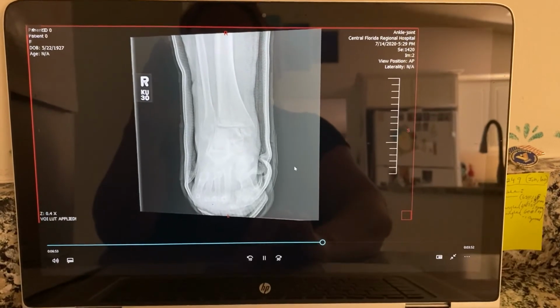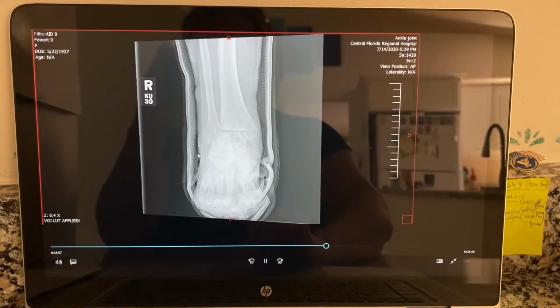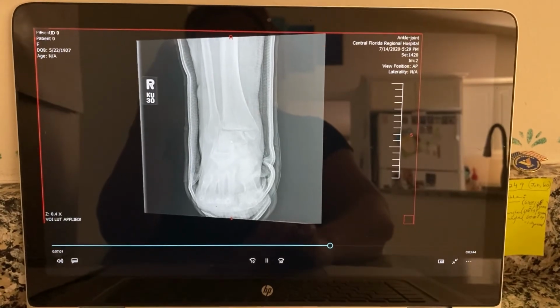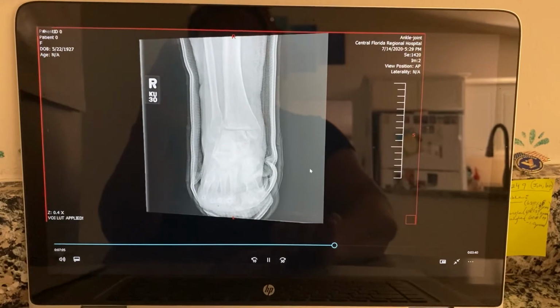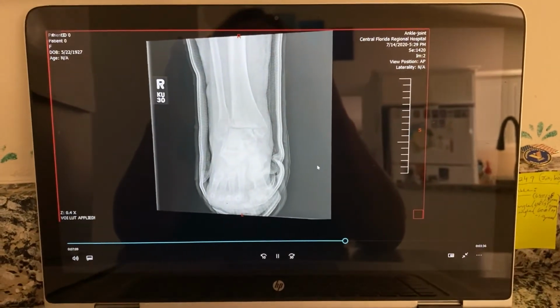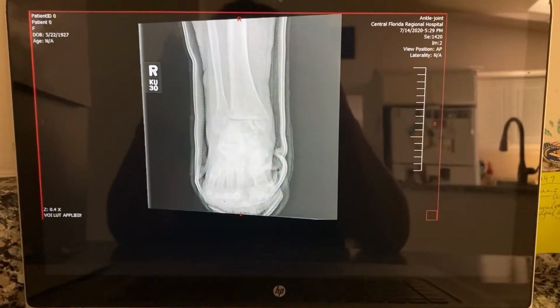The presence of the distal third of the tibia and fibula and proximal metatarsals, and both malleoli, and an entire mortise joint open would show proper positioning. For the patient's pathology and positioning, the mortise joint is as open as could be.